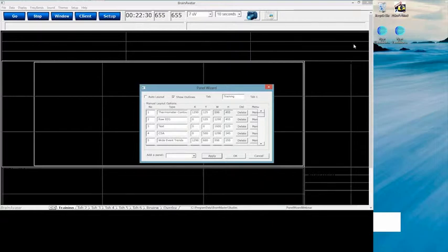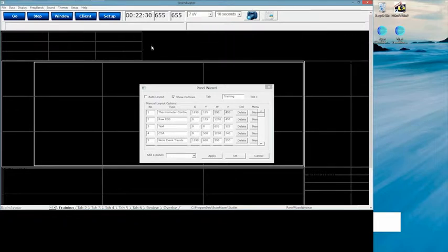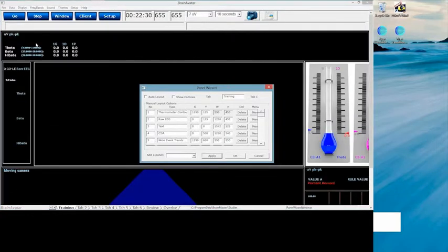So what this is going to allow me to do is click right in this box right here, and as I'm holding it down, move to the left. And as you can see, you're going to notice not only is it changing in the width height box right here as I'm doing this, but the actual box itself is shrinking in size. So that when I set it right about here and hit this, we can now see the outline of the box right here, and we can see the size of it. So now what I can do is utilize this the entire way around to change my screen around. And that's what we're going to do.